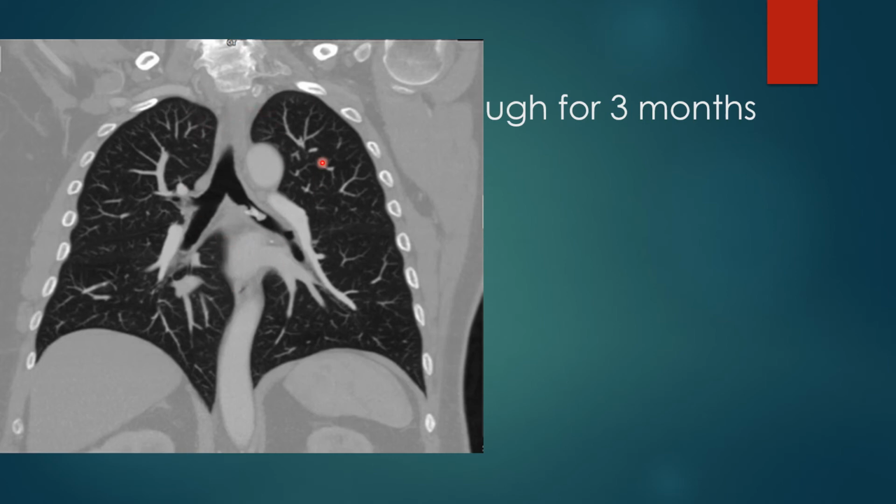So my assumption is they did a CT, probably due to the fact that the patient didn't realize he actually inhaled a foreign object, and also to rule out any lung or thorax pathology. So you can see with this lung window, it's very easy to appreciate the lungs, but you do lose some resolution out here. You can appreciate the aortic arch and descending aorta, looping over the left pulmonary artery and the left main stem bronchus with that foreign body right there, that little chicken bone. Again, calcium would show up, but as you can see right here, it is taking up a good portion of the left main stem bronchus.